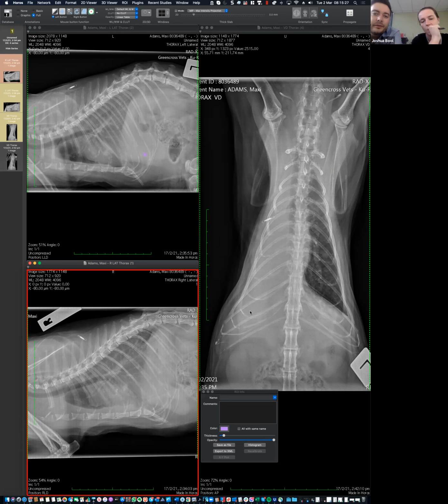I think it would have to involve the lung being filled as well. And I guess, and this is more of a question, would pleural effusion push the heart as well, given that it's a space, unless you're collapsing the lung, I suppose, and that's taking up the space there. But I imagine in this case, where we can't actually see lung lobes very easily, if we had lungs filled or collapsed, with marked pleural effusion, we might see the cardiac silhouette pushed more to the left, but I'm not too sure about that. That's just my thoughts.